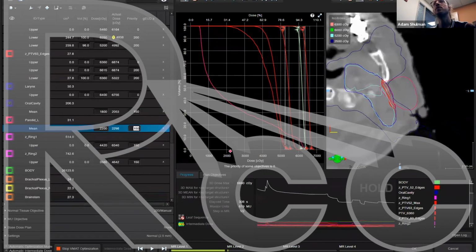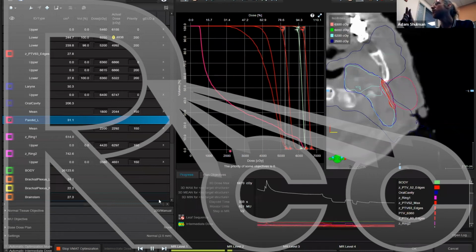And so what you would do as you're progressing to step 3, for example, we just want to fine tune those MLC motions, but we don't want to sacrifice all of the gains that we've made on the major MLC motions. What we would do is, we're just going to let this get to step 3, but in all the steps, what we would do is we keep pushing each organ at risk one at a time. I'm only showing you one organ at risk right now, the parotid, just to show the concept. So as soon as it gets to step 3.